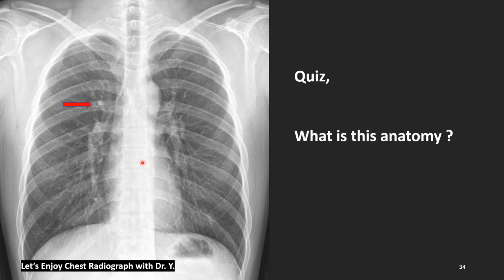This slide is just a quiz for the next session. What is this? A small, round, empty ring just beside a same-sized, round, full white moon, a full moon.